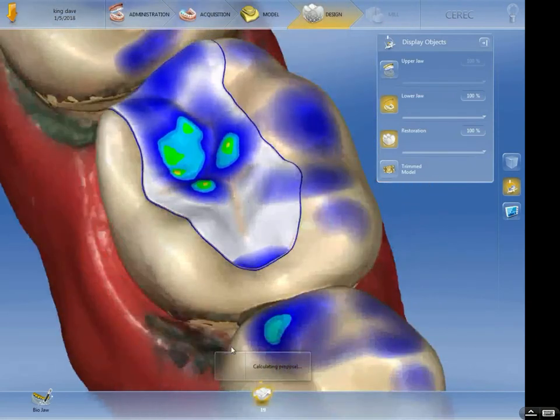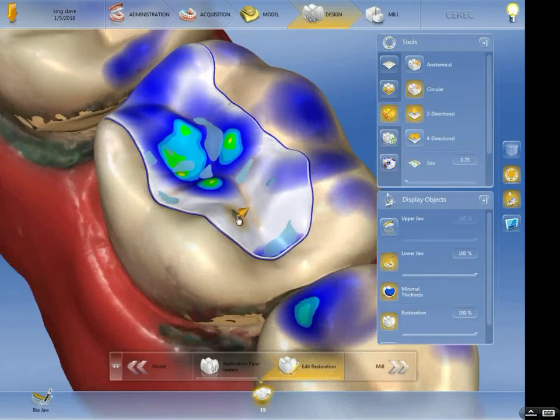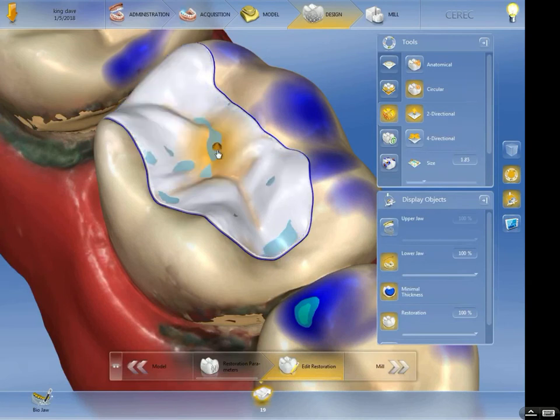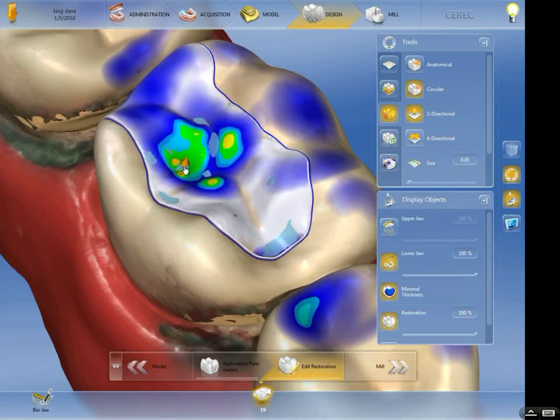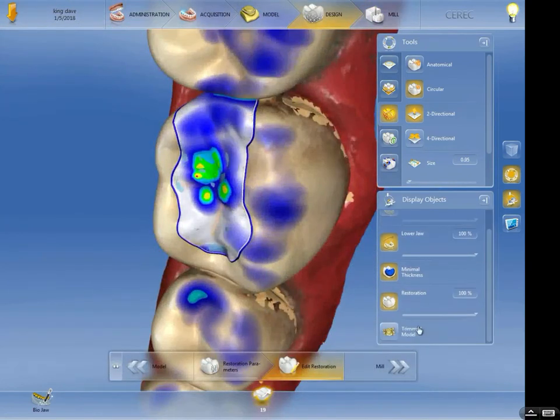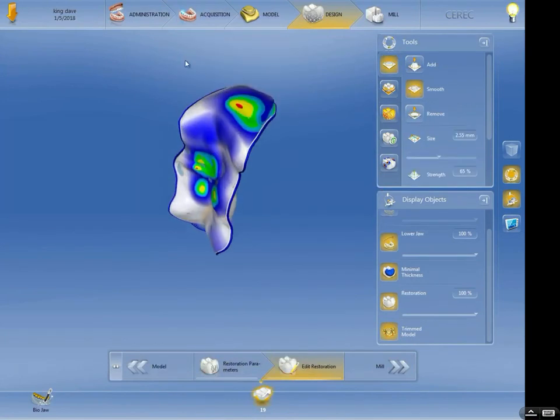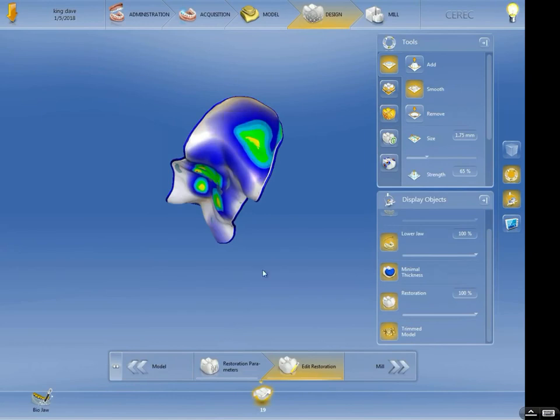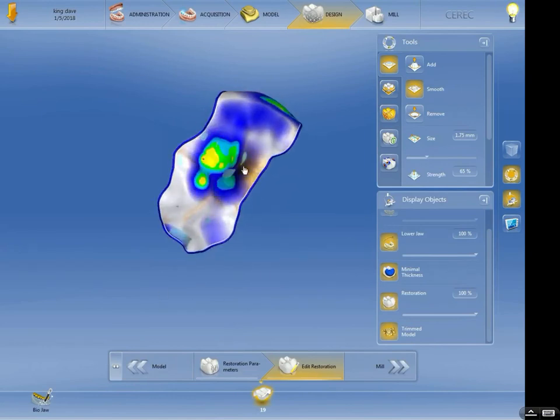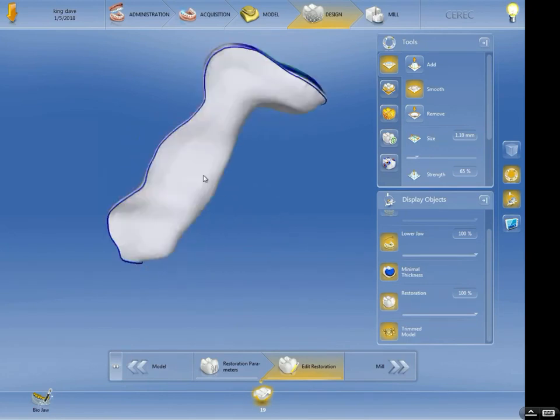It's calculating down here on the bottom. There we go, that's a lot better. And honestly, because of the occlusal offset that's already set in there, having a little bit of yellow or red is just fine. Let me check the contact. I'm going to trim, take everything away, add a little bit to that contact, smooth it back just a smidge.